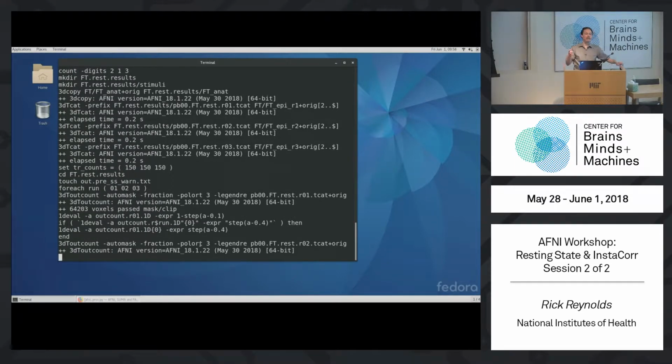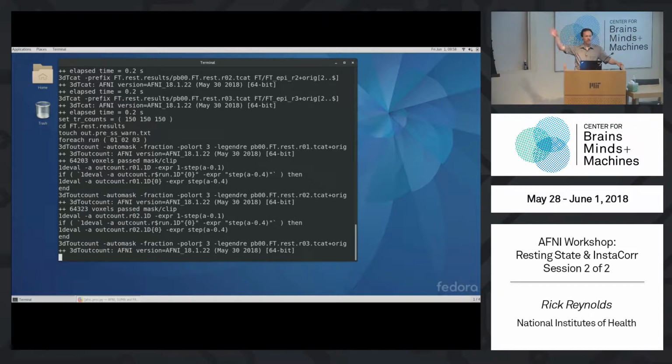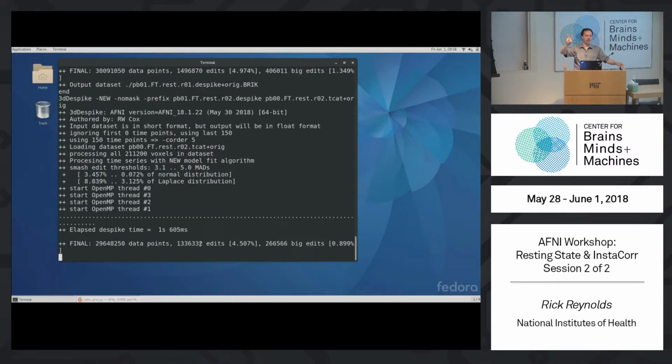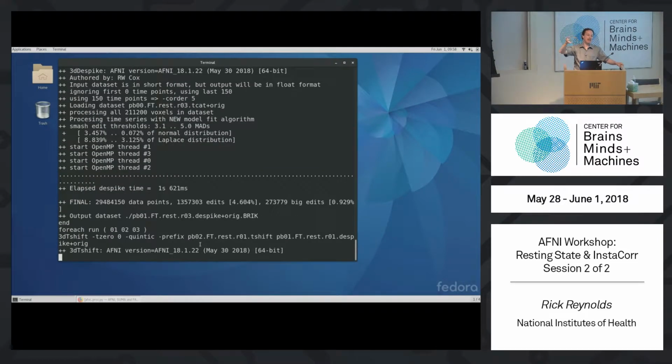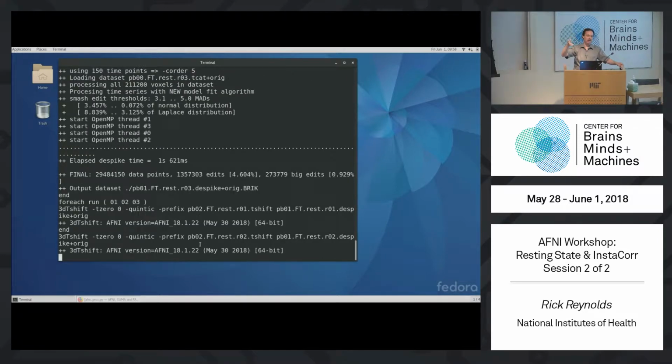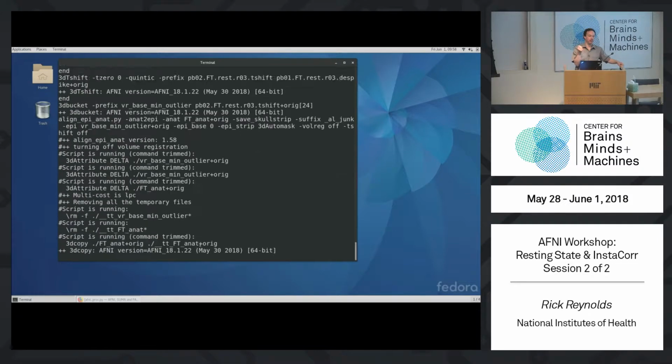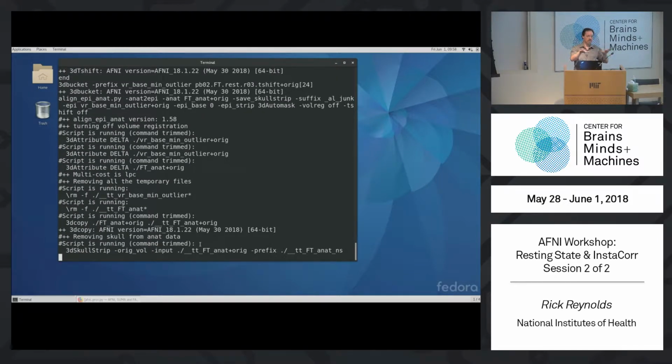That's piping. When programs dump stuff in your terminal window, it's often written to two file streams, even though they're both displayed: standard out and standard error. Standard error is a separate file stream for special messages, so you can capture the errors differentially, but it all appears here. So if you want to capture everything, you have to capture both streams, and it pipes the standard error and the standard out to the same stream so that you can capture it all.